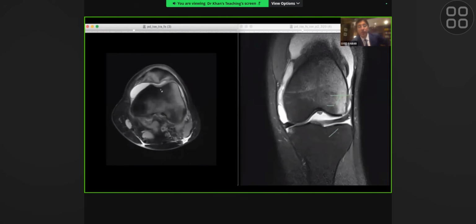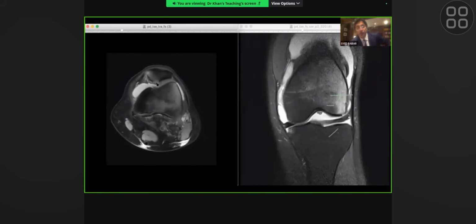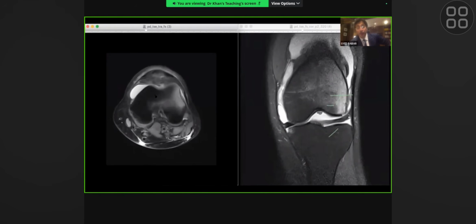You sometimes can disrupt the cartilage, and most commonly the cartilage goes from here, because as the patella slides across, it degloves the cartilage from here and takes a piece of the cartilage, which is torn off. Or where the patella apex hit the bone, that's where most of the damage is. So what you can see here is that this cartilage is abnormal. See the black line? That's the cortex. Where is the black line here? You don't see it. And then you see the black line here again, which is the cortex. So there's definitely been an avulsion or some sort of bony injury of the patella apex with damage to the cartilage. And that's why you've got the fat fluid level.